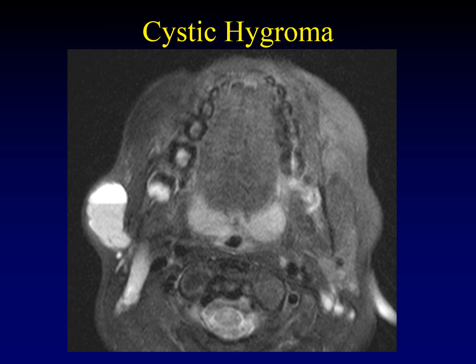Now, lymphangiomas come in two forms, macrocystic and microcystic, and the term cystic hygroma, which is now outdated, refers specifically to the macrocystic form of lymphatic malformation. The macrocystic form will often have debris within a larger cyst instead of small, tiny cysts that are all clustered together, and that debris can form a layer. So this is another finding that might indicate lymphatic malformation, specifically the macrocystic form, previously called cystic hygroma.